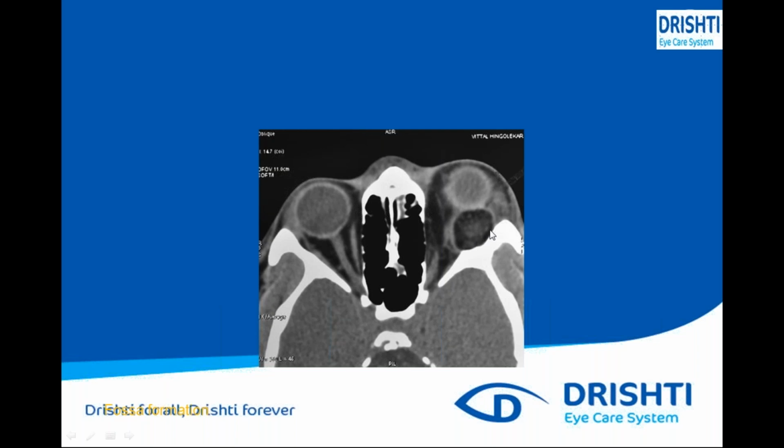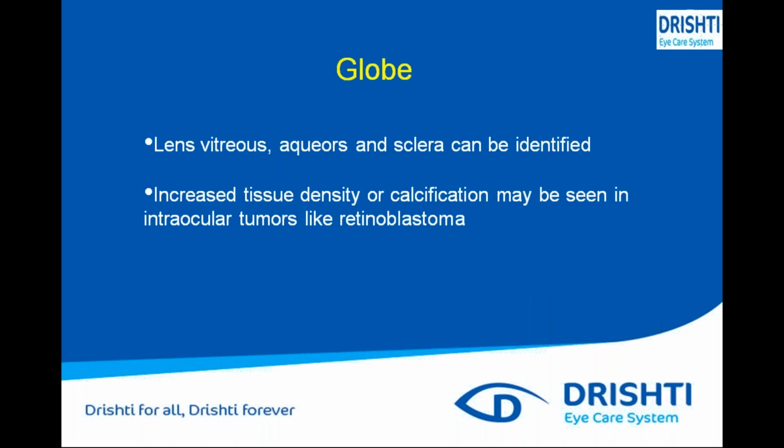If the mass is sitting in the bone, it has depressed it, and a few bony erosions have been made. So in this way, the bone parts have to be seen.